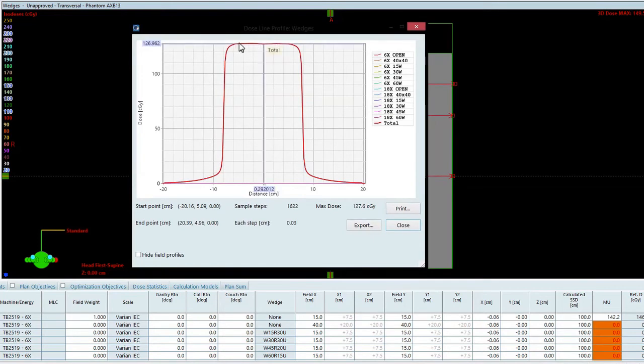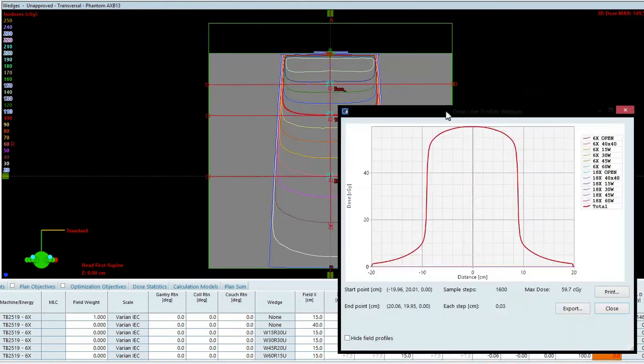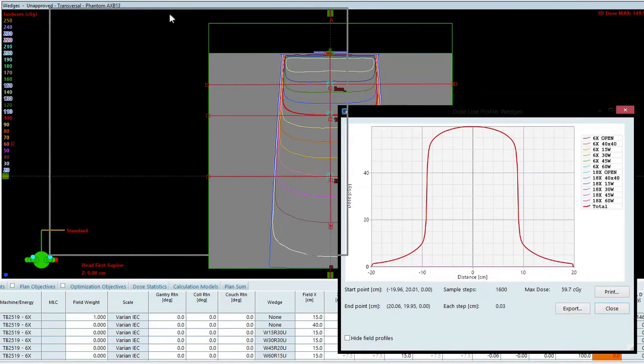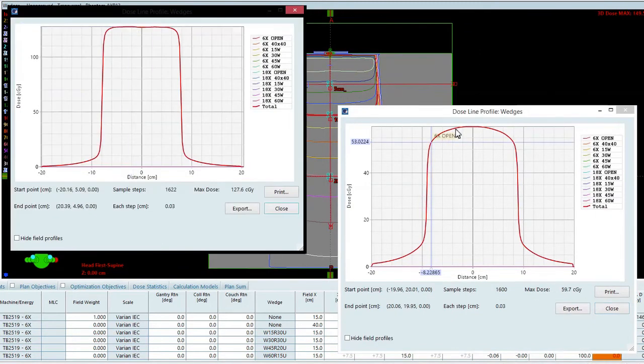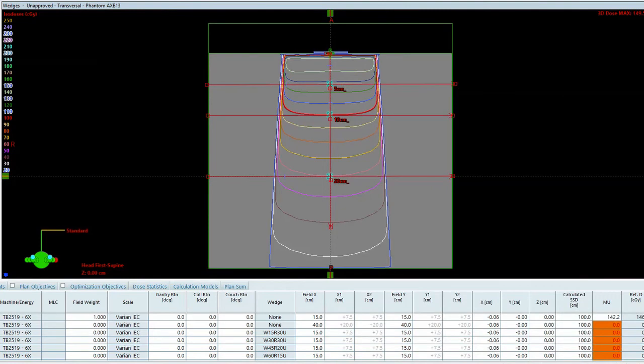We have a slight increase in intensity in the shoulder region. These are horns caused by the flattening filter. As we move deeper into the phantom, the shoulder region becomes predominantly more rounded because of the preferential beam energy difference between the lateral portion and the central portion caused by the flattening filter. As I change energy, the general field shape remains similar for open fields.